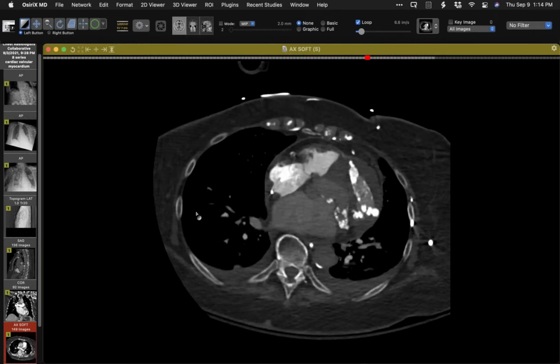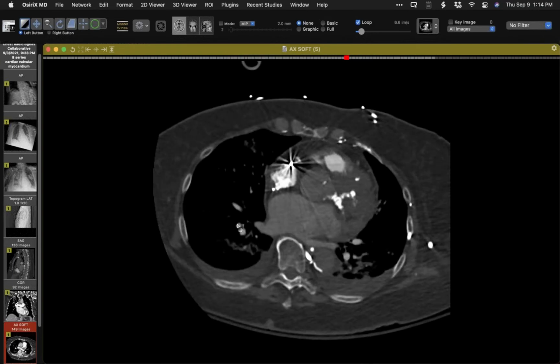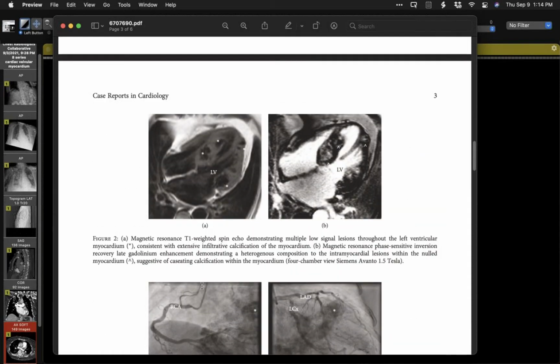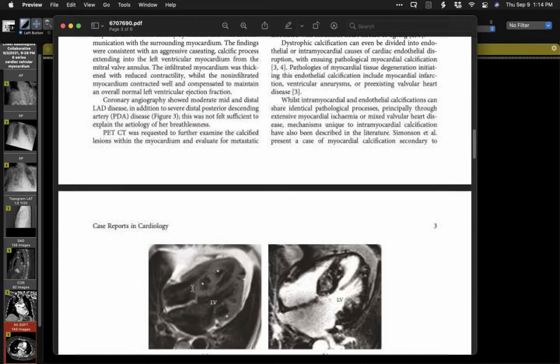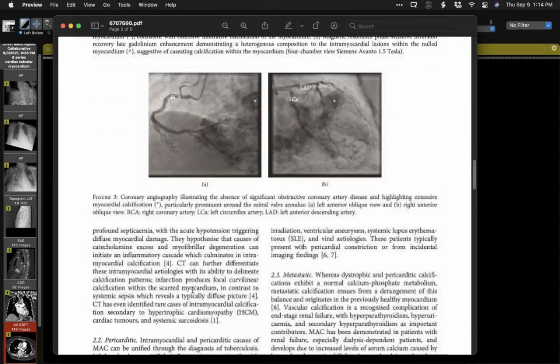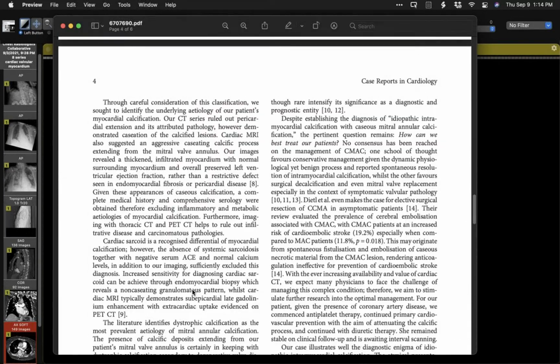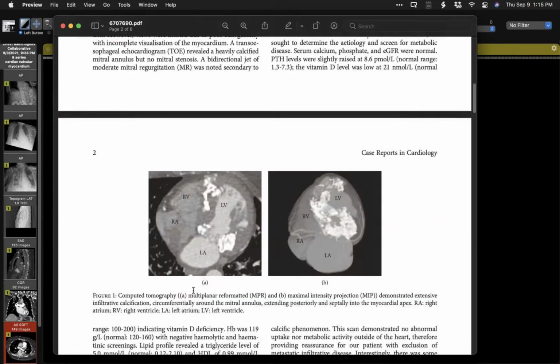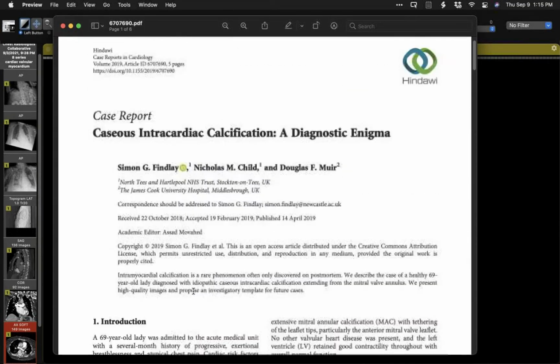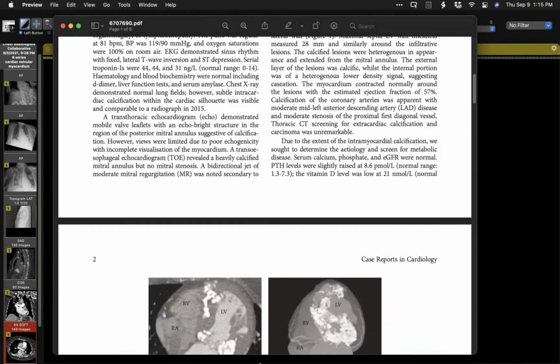I've seen it a few times. And one of the interesting things also, on the paper they show, you can see the areas in the myocardium are enhancing. On the delayed gadolinium images there, you can see it really well in the septum. And so there's certainly an inflammatory component. And the parts that infiltrate into the myocardium oftentimes can also be quite thrombogenic. And so sometimes if you look at the surface, they'll generate thrombi along the areas where either it's myocardial or pericardial that's just pushed very close to the endocardial surface.